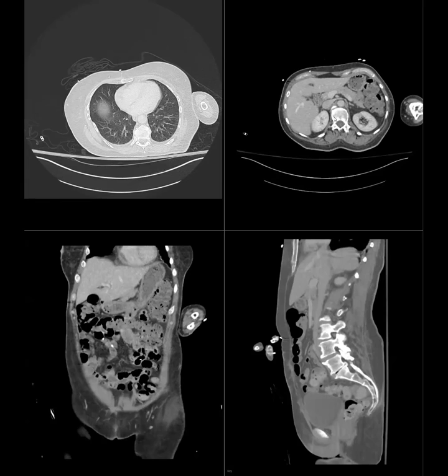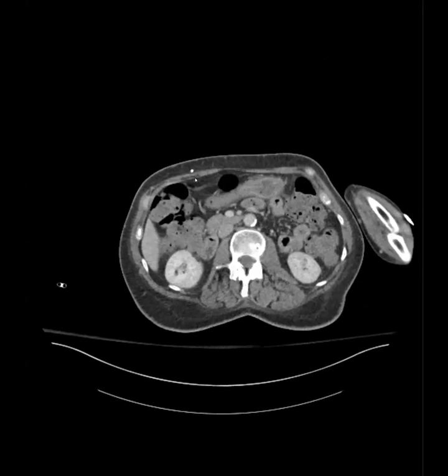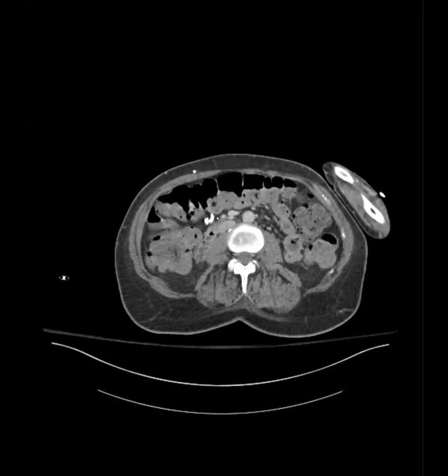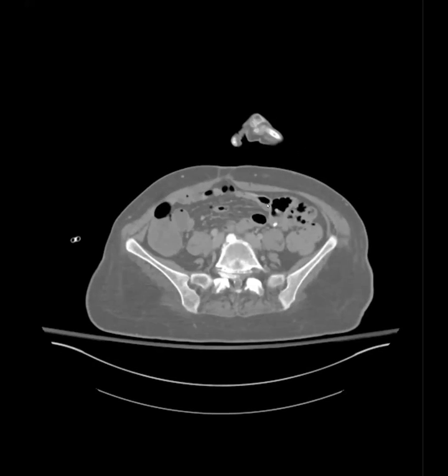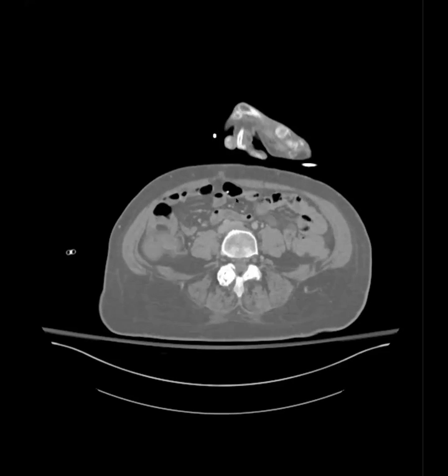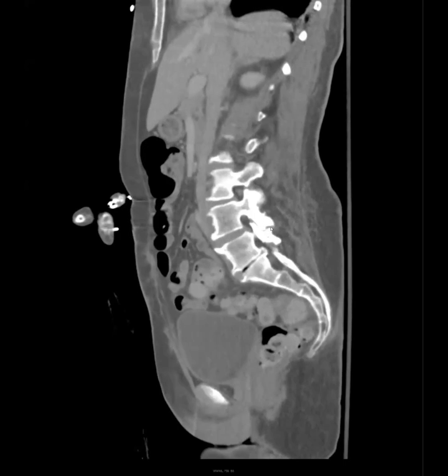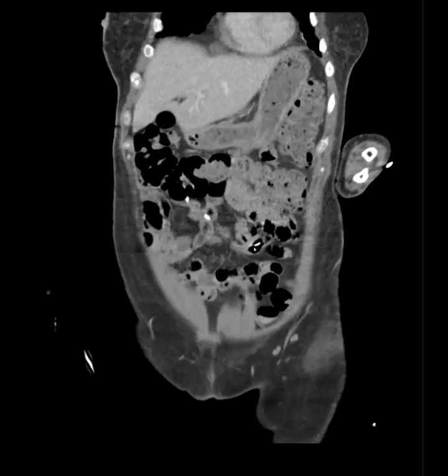This is kind of interesting because the patient's prior study 5 years earlier shows an alternative complication of the same thing, basically things that can go wrong with CSF shunts. On this one, if you follow this CSF shunt, it curls around in here, and then if you follow this part, it ends up in the lumen of the small bowel. When we looked at this, I remember saying I'm pretty sure it's in there, because you can't get a picture like that without it being inside. Then we looked at it in multiple planes, here it is, oh my God, going through, and here it is going through bowel.